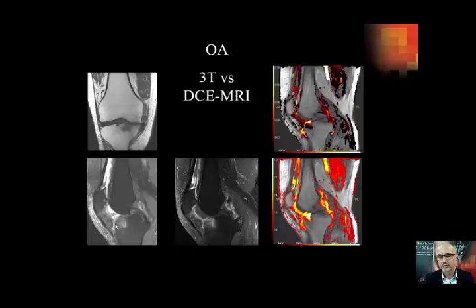As we've learned in the inflammatory joint diseases, a lot of the disease happens in the synovial membrane, with a more homogeneous enhancement in that synovium, whereas in osteoarthritis it's a more focal, more spotted enhancement pattern with local areas of high perfusion and areas with lower perfusion. This might explain why we have had problems assessing what is actually happening in the synovium and in the bone when you do a biopsy from those areas, because of this typical osteoarthritis appearance. But DCE-MRI will probably give you an aid in assessing the highly perfused areas and enable a more dedicated biopsy approach.